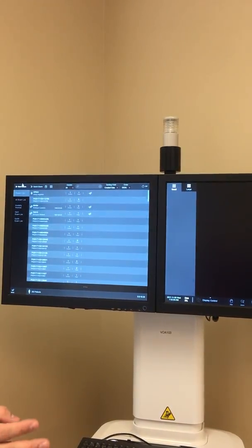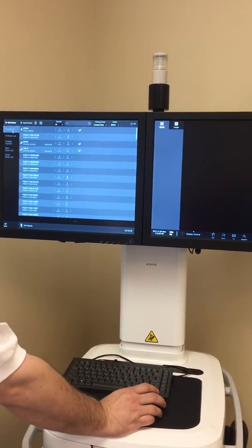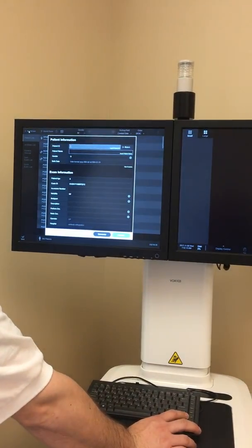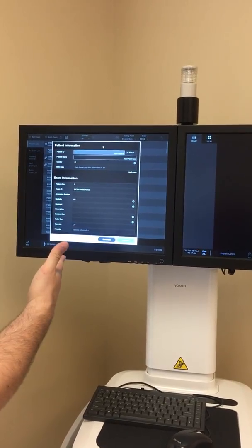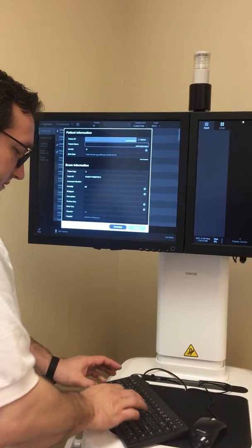Let's say you start the unit up, you're ready to go, you want to start a procedure. So you can ignore this whole list. You can say, all right, let's start an exam. We've got a chart. We can pull a patient ID, patient name, birthday, all that kind of stuff.